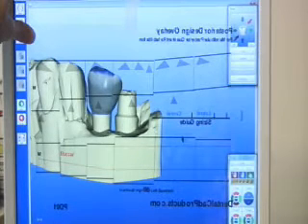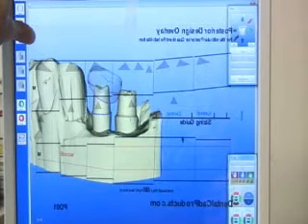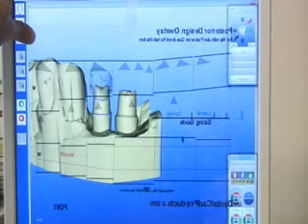By using the scale tool, if we click on the bottom line and then the space bar, we're able to highlight the whole restoration. We can hit larger or smaller, or I find it easier if we go back to the construction lines, in which we can do larger and smaller for the mesial distal. We can position the construction lines, change the angulation by using the arrows at the top of the buccal view of the posterior overlay. It gives an indication of where we want our cusp tip to be, and also how our marginal ridges should be.